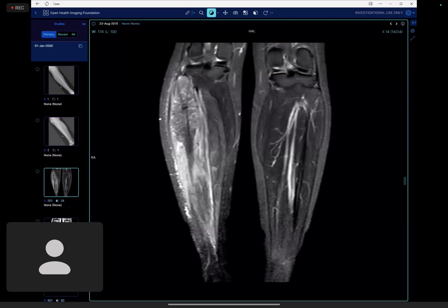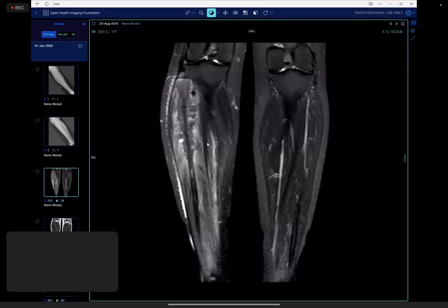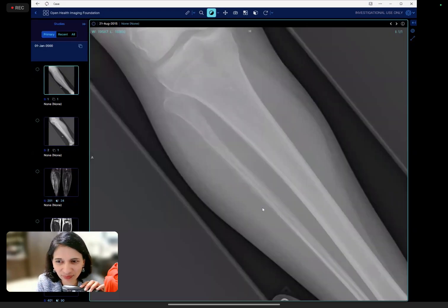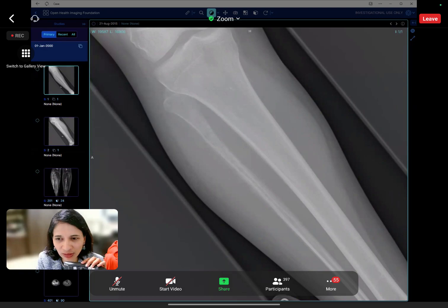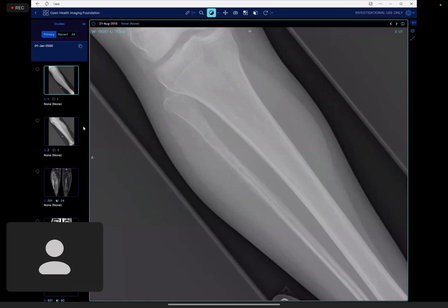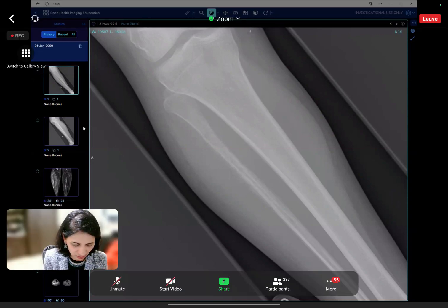So you said lymphoma, that's also a good call. But if you look at the bone, you usually get more sclerotic areas and things like that in lymphoma. This is more lucent with periosteal reaction. But I wouldn't say lymphoma is completely wrong. So that's a good call, but don't forget mets. Okay, that's good. So next one.